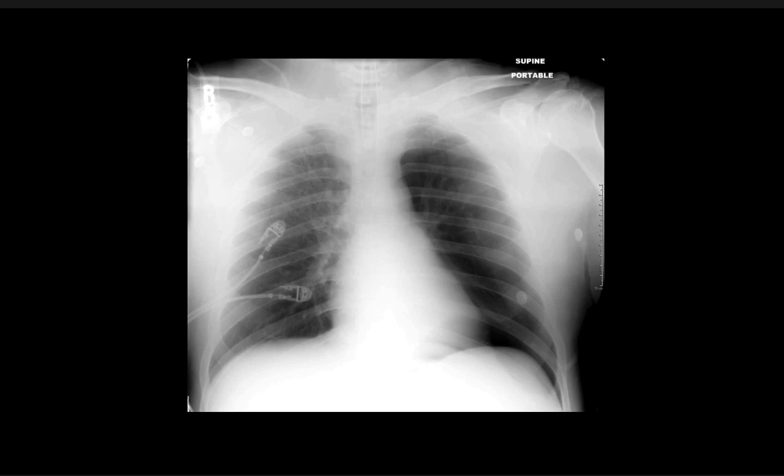Why? Symmetry. Symmetry is better seen when you zoom out. So I'll show you an example here. Just look at this shape for a second. I think that looks pretty symmetric on each side. Now when I zoom way out, maybe here you can appreciate that the yellow part there is skinnier than the red part on the other side. I think that's easier to see when it's small.